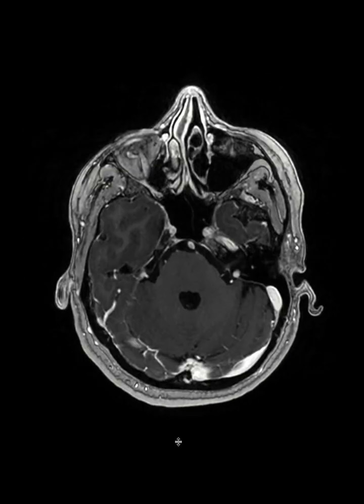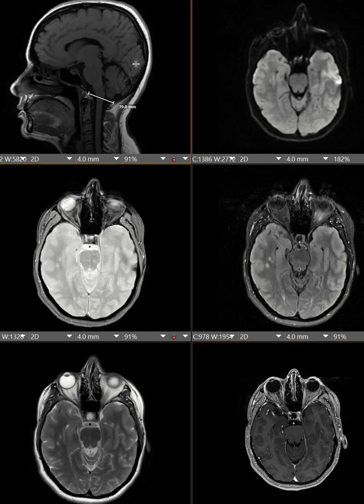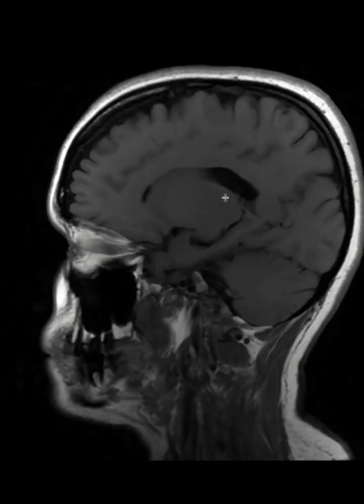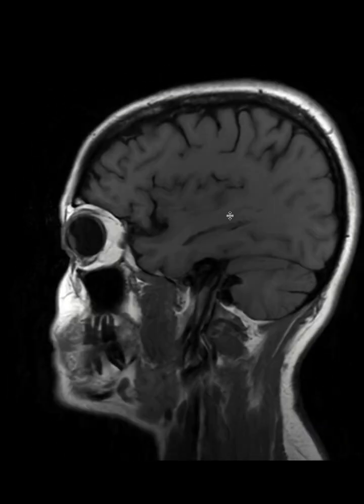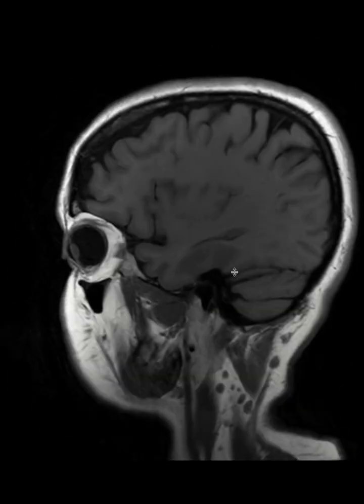They are oval shaped. In distribution, we have to talk about juxtacortical or periventricular, and also we have to talk about brainstem involvement, corpus callosum involvement, cerebellar involvement, and then we have to talk about whether these lesions are restricting or enhancing, and if they have corresponding T1 hypointensity, which is a prognostic factor. If they have corresponding T1 hypointensity like this one, as you see here, it has a little bit worse prognosis, and shows that this disease is going to be more on the side that doesn't have a good prognosis and keeps progressing.